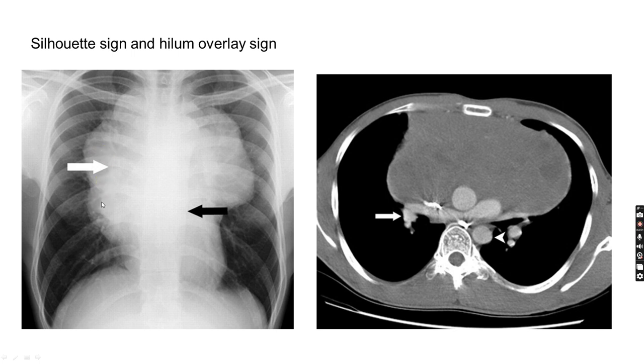Why can you see it? Because this lesion is not in anatomical continuity here. So that's why you can see the margin between the two better. In other words, silhouette sign is not present, it is not silhouetting the right hilar border.